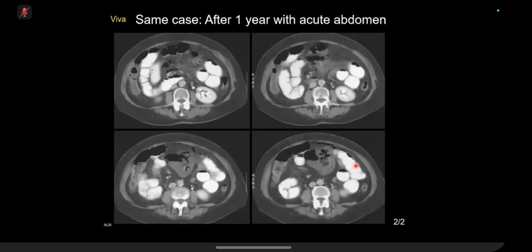So there's some ischemic small bowel loops with 3 gas locules. Why do you say ischemic bowel? Doesn't appear to be enhancing. You see, these loops have got contrast. So the point is that look at the mesentery.